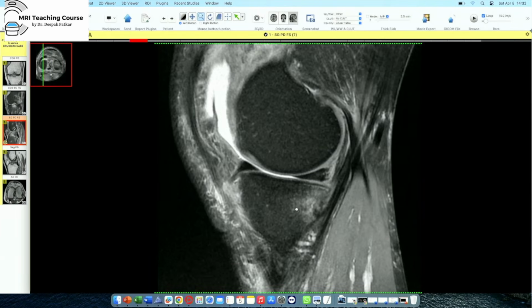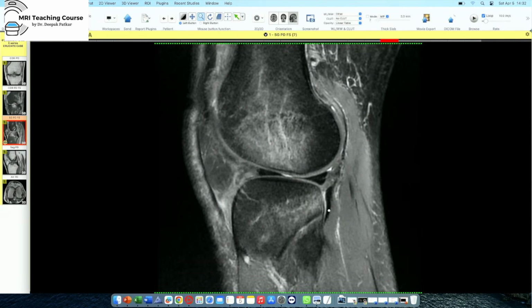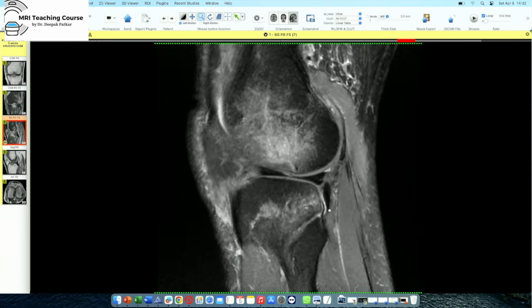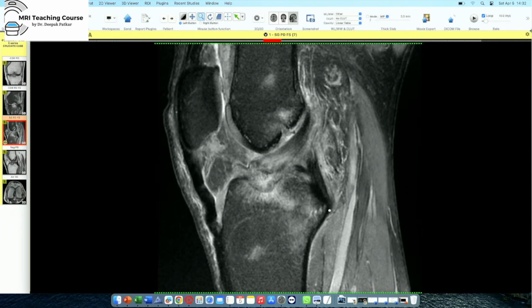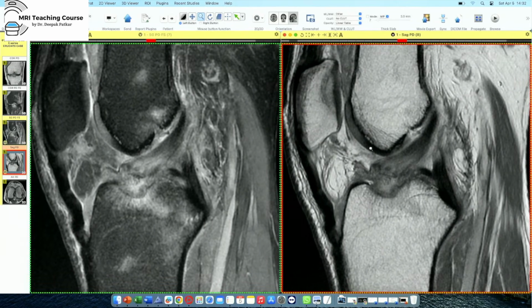Okay, same again: posteromedial tibial marrow edema, anterolateral femoral and posterolateral tibial marrow edema. This means that this patient has some form of ACL injury. Now what is that injury? It's basically an avulsion fracture. Even avulsion fractures can be very slender, subtle, often difficult to see. But remember, distal tibial attachment ACL tears are very, very rare.